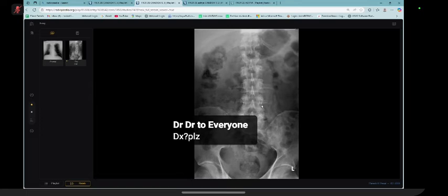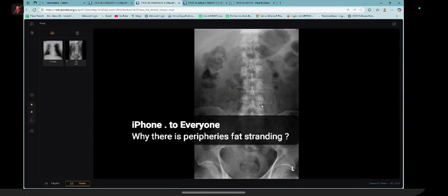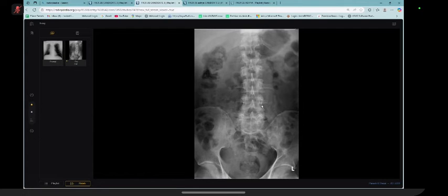So I've been presented with the X-ray abdomen of an adult, in which the thing that I instantly note is the loss of pedicle. Do you think it is the X-ray abdomen? Sir, does it cover the entire abdomen? No, sir, spine, preferably. X-ray of the frontal projection, AP projection of the lower lumbar spine, in which the first thing I note is a lytic area involving the left pedicle of L2 vertebra, which is called the winking owl sign.